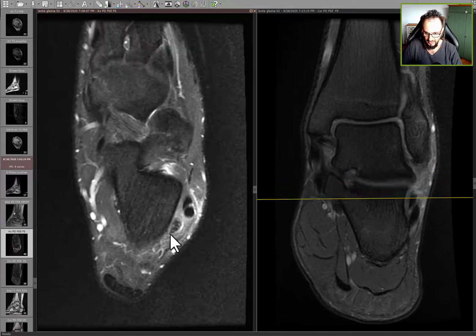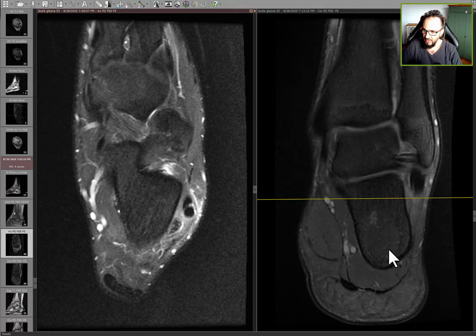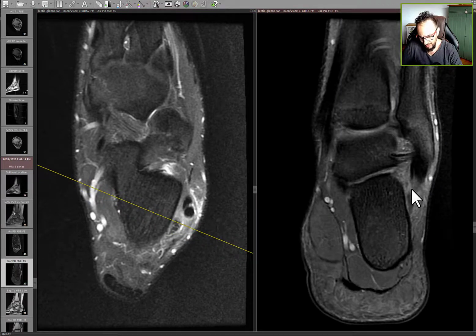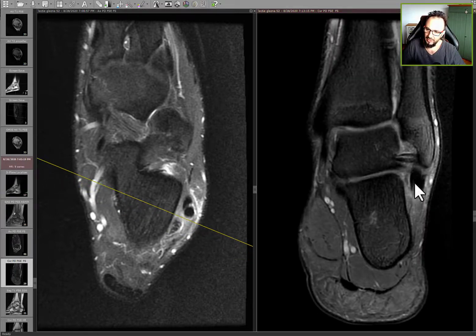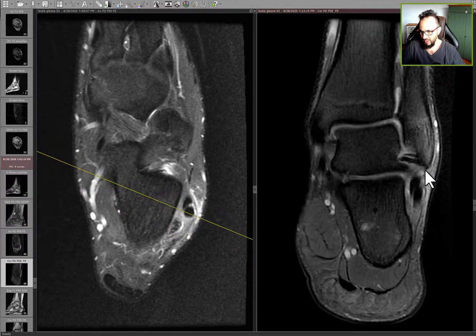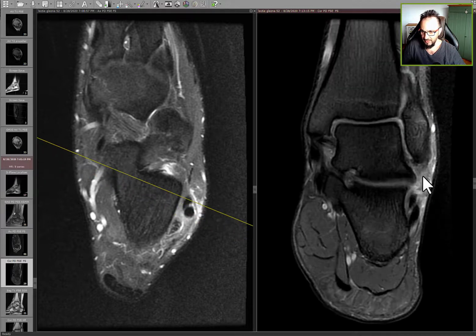So this is very interesting, because he managed to rupture this fibulo-calcanean ligament. In the first trauma he managed to tear ATFL, and on the second trauma, after 9 months, he managed to tear the fibulo-calcanean ligament.